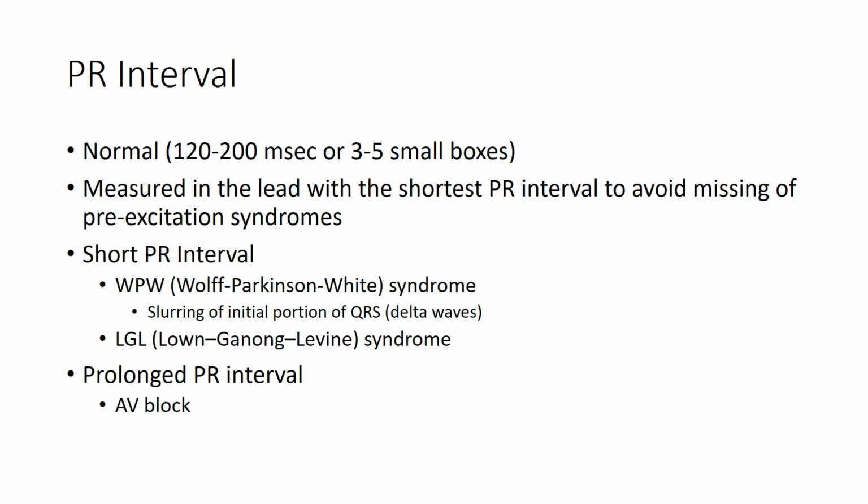And the prolonged PR interval represents a delay in conduction at the level of AV node, and it represents AV block. So here we conclude our discussion on heart rate determination, axis determination, P wave and PR interval.